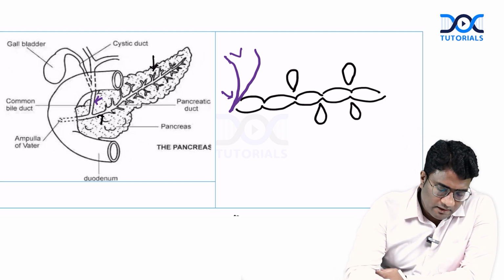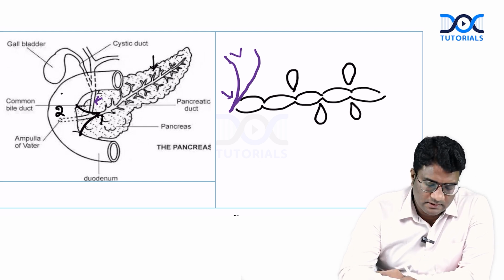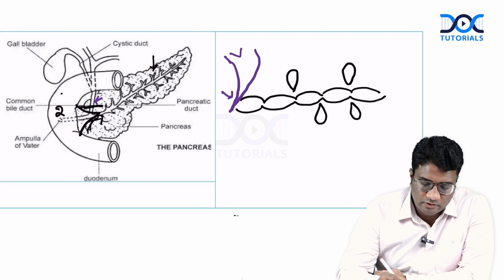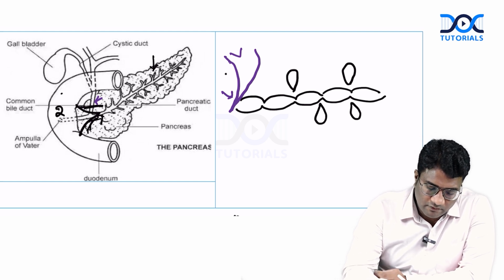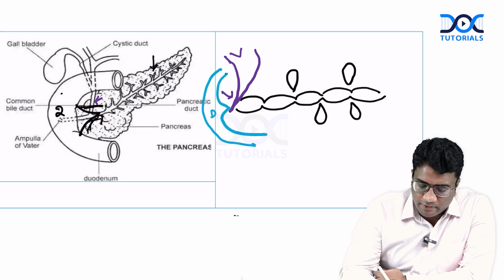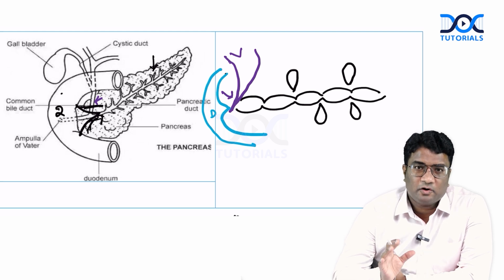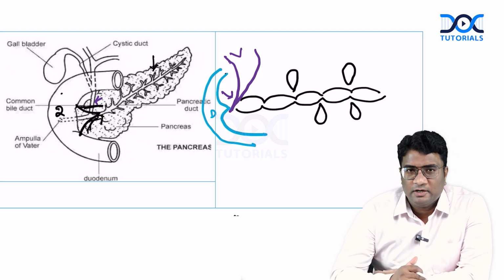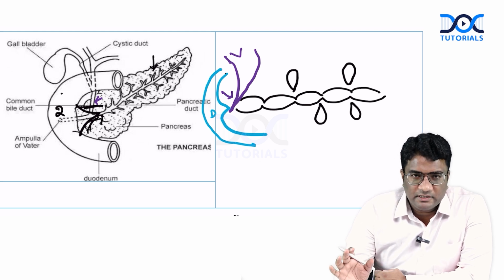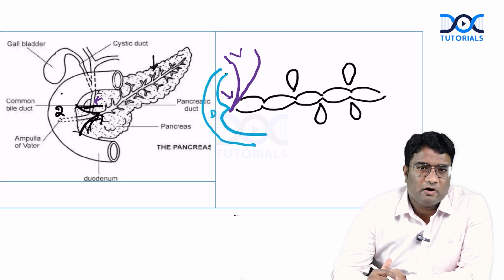And because of the fibrosis, the medial wall of second part of duodenum will also be pulled inward. So this is the second part of duodenum, the C-shaped loop of duodenum. So you get a reverse 3 sign of Frostberg when you do the barium study. So what are the findings that you see in chronic pancreatitis? One is calcification. You will see a beaded appearance of the main pancreatic duct, chain of lake appearance of the side branches, distal CBD stricture, and reverse 3 sign of Frostberg on a barium study.